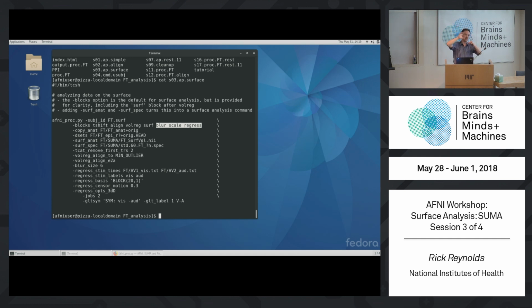If that intersects 3 voxels, break the segment into 10 node pieces: maybe two of those pieces are in one voxel, 5 in the next one, and the last 3 in the next one. You can take that weighted average of EPI values and have that as your surface value. But as a parameter, you also choose how many voxels you will consider.